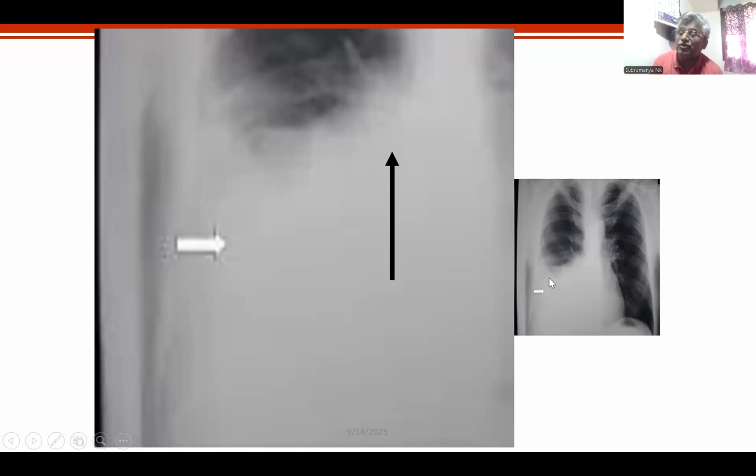Can you see that there is loss of lucency as you move from below upwards? It is not the lateral ascent that you should look for. It is not just the density. If you look from below upwards, the liver density merges with that of the fluid density, and therefore it is not pneumonia but effusion. Did you all like this? And you can diagnose radiological pleural effusion.